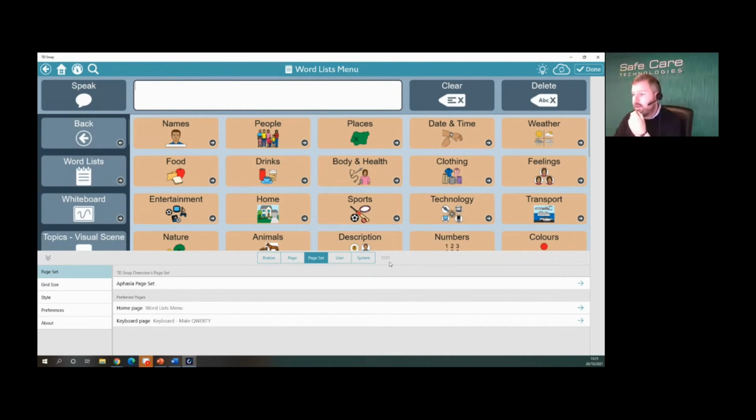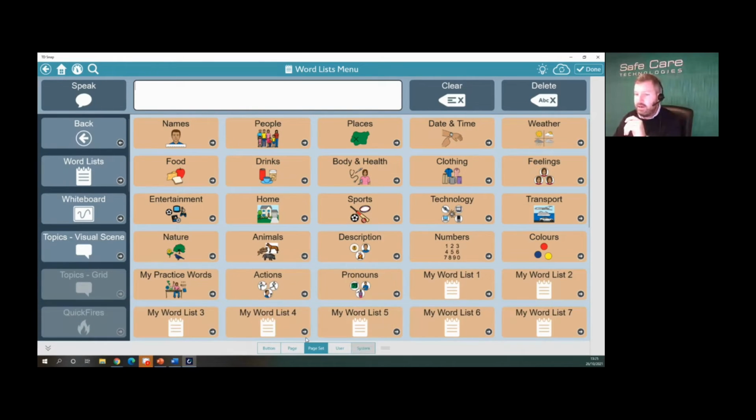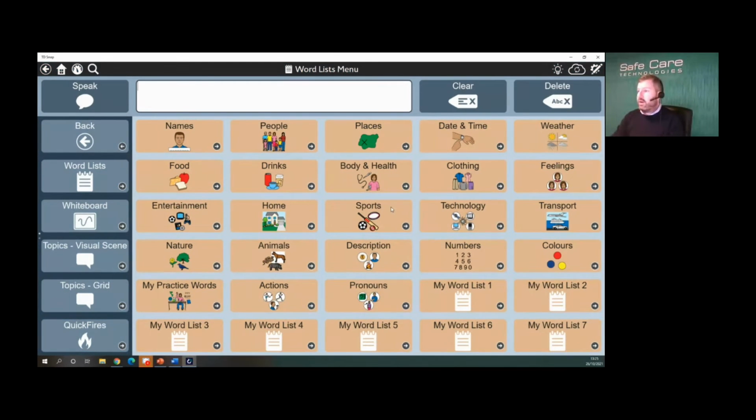If you have any questions as I'm going along, just fire them into the Q&A area, and I can go through anything, or if you want me to go through anything in a bit more detail, we can do so. I'll bring it back, and done. So that's the software itself.